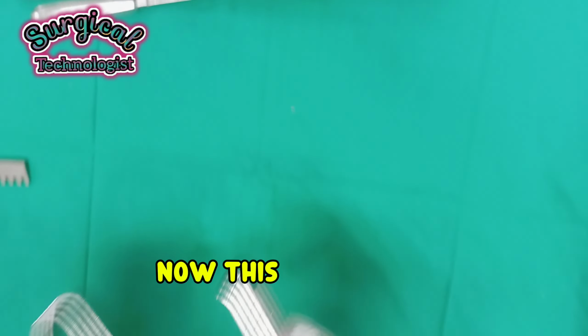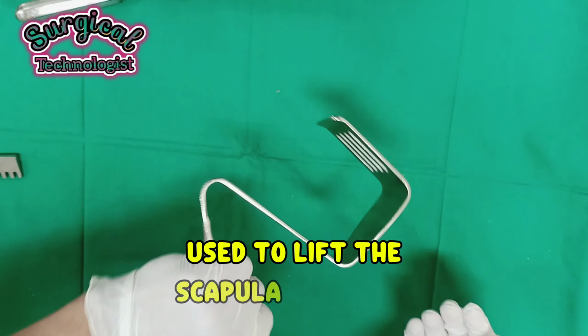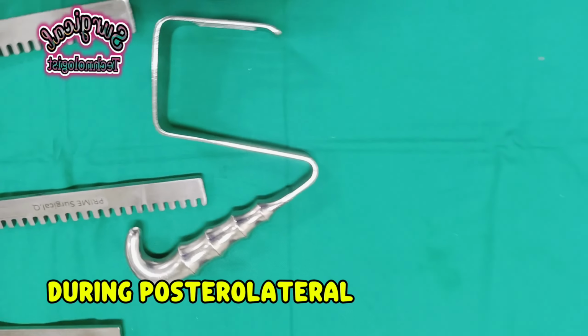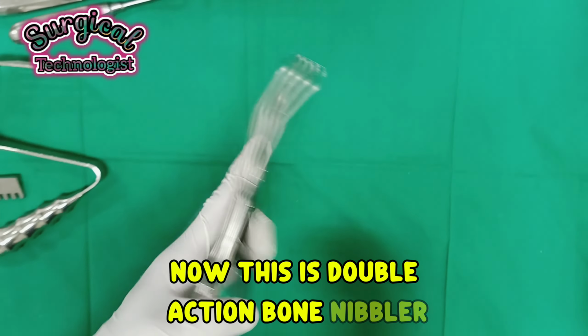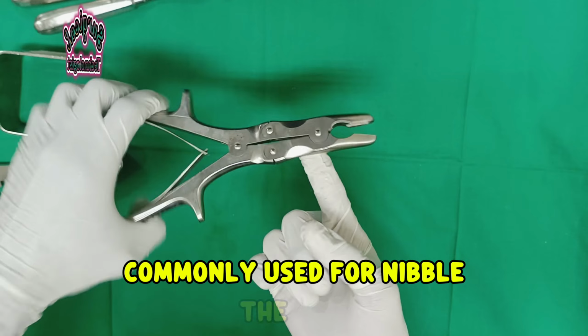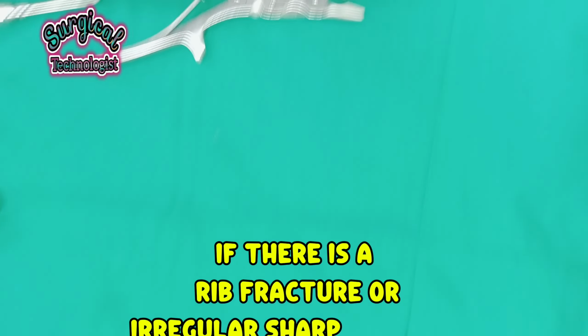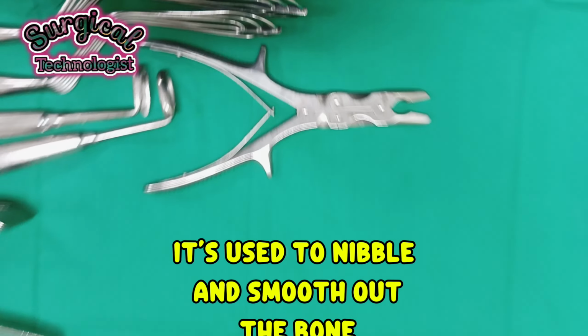Alright, now this is the Davidson scapular retractor, used to lift the scapula to expose the ribs and chest wall during posterolateral thoracotomy. Now, this is the double action bone nibbler, commonly used to nibble the bone. If there is a rib fracture or irregular sharp rib edges, it's used to nibble and smooth out the bone.